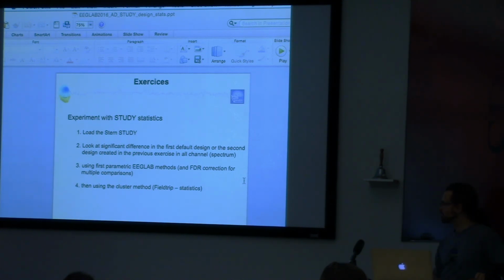I just want to advise you, this one is very slow. So, don't be like, oh, I've been waiting 3 minutes. Well, that's normal. We actually have a version that's 1,000 times faster, but we haven't released it yet. So just be aware when you click that button. It used to take 1 second. Well, now it's going to take 3 minutes to correct for multiple comparison.